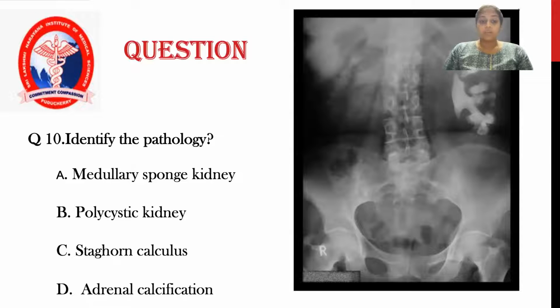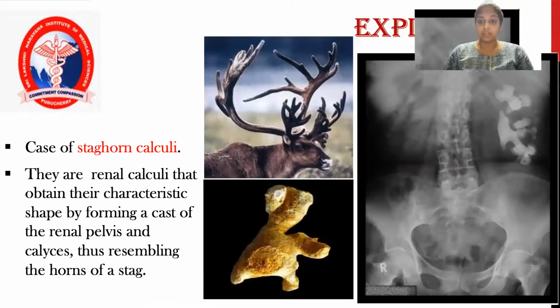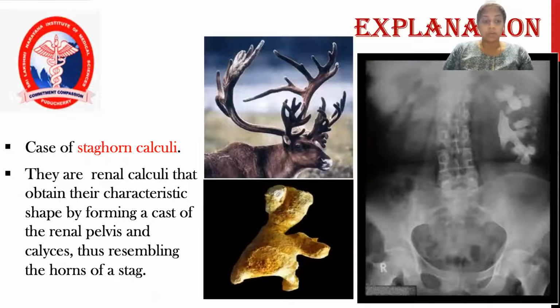Can you all identify this pathology? Can it be medullary spongy kidney, polycystic kidneys, staghorn calculus, or adrenal calcification? Yes, it is a case of staghorn calculus.